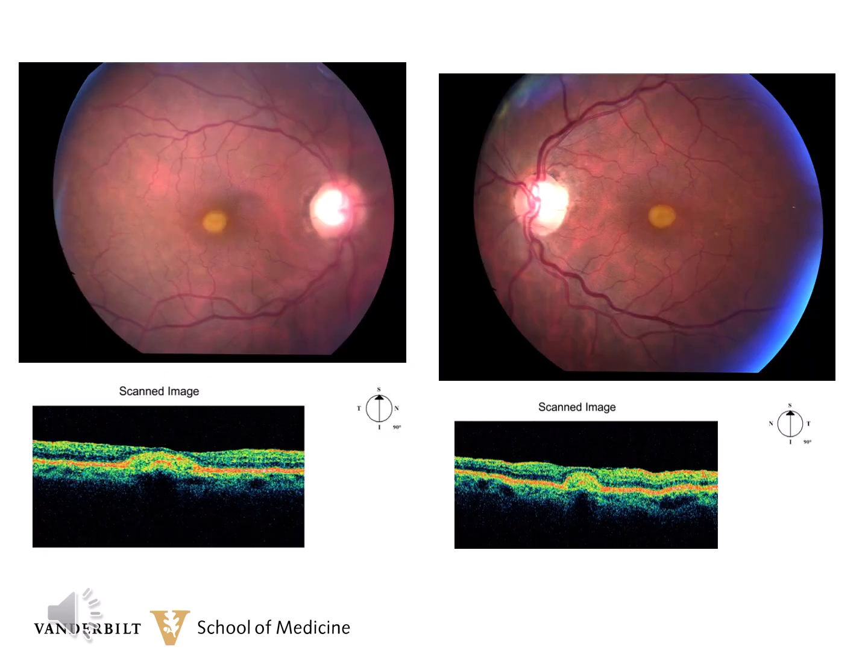You saw the 74-year-old as our first example in this chapter. She has a typical vitelliform lesion of the adult onset foveal macular dystrophy, or type 1. Down below the clinical, you can see an older Stratus OCT, but it shows the very typical hyperreflective lesion in front of the RPE and under the photoreceptors.